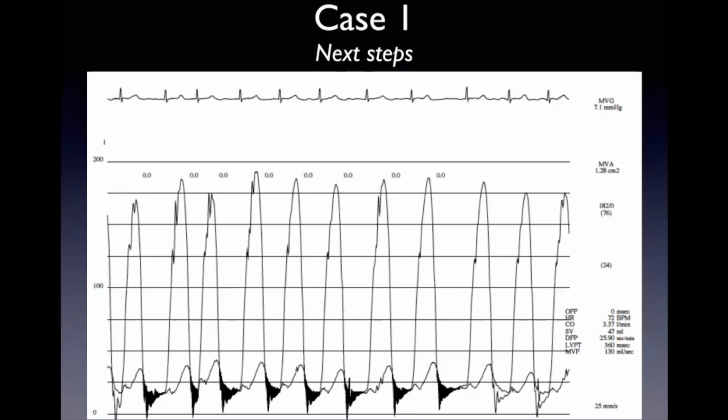That actually correlates nicely with echocardiography, as it usually does. And the valve area by Gorlin formula is 1.3 square centimeters. I'm not sure if Dr. Chisholm did this cath or helped guide the cath with the colleagues. They put a balloon across the ASD and temporarily occluded it.